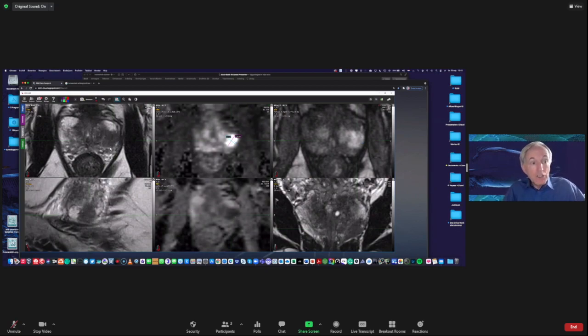It's a focal lesion on T2 over here. This is the sagittal image, coronal image. So it's a 5 as well. And it shows early enhancement here on DCE. So the score is 5, 5 plus, which gives a final score of PI-RADS 5. So the assessment is 5.